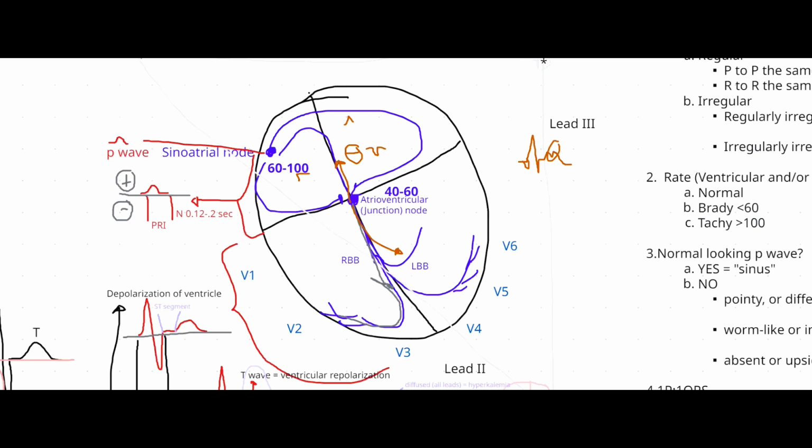So if you're seeing maybe 30s, you know it's probably somewhere in the junction, well, a little bit closer to the junction still. If you're seeing a rate of maybe 20s, you know that's somewhere down here, which is not good, right? So this is about 20 to 40 in between. Pacing, but we'll talk more about that in a minute.